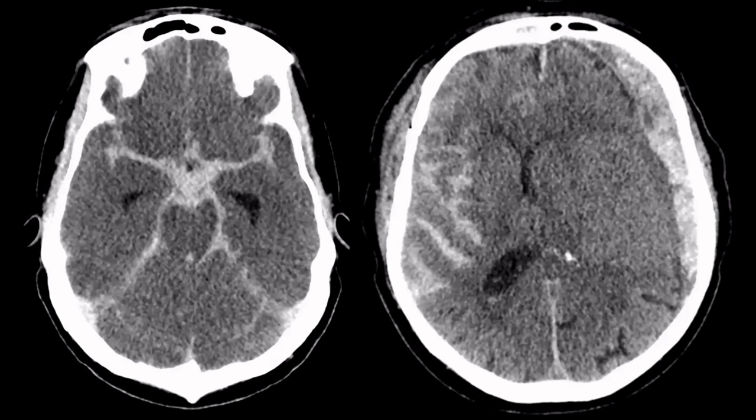Can you tell the difference, or can you predict if a hemorrhage is going to be traumatic or caused by an aneurysm? Nothing is 100%, but most cerebral aneurysms are located at the base of the brain, so that is where you will find most subarachnoid blood. An aneurysmal subarachnoid hemorrhage will mainly be located in the basal cisterns and less along the cerebral hemispheres. This is a typical pattern as can be seen in a ruptured cerebral aneurysm. In a traumatic subarachnoid hemorrhage, the blood can basically be located anywhere, but the predominance of blood in the basal cisterns will often not be present.